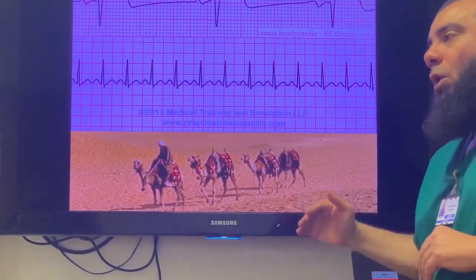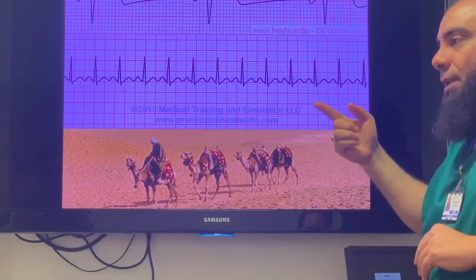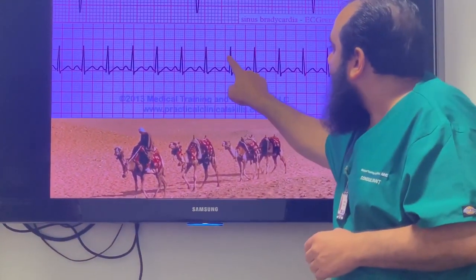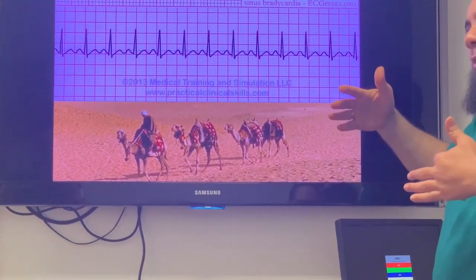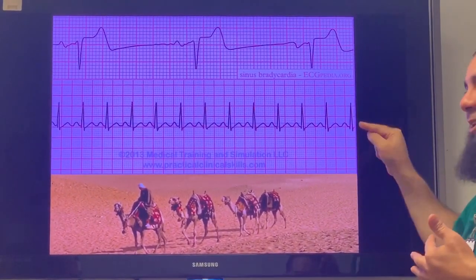So something below. 3 big squares is 100. 300 by 3 is 100. So it is somewhere between 100 and 150, and it depends on how many small squares. So I can tell 120, 125. You need more accurate? Yes, 1500 by small squares.